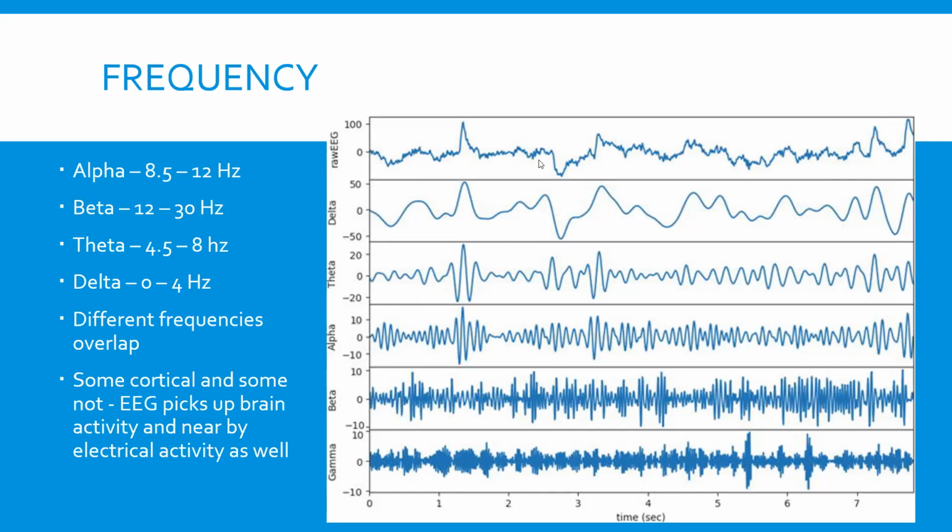So usually the raw EEG needs to be processed so that it's visualizable, right? But it's also important, when you're reading the EEG, to understand that usually we're not looking at just one frequency. There's also this embedded smaller stuff, right? So you see the big delta, and then inside it, on top of that, there are all these smaller frequencies. And that makes sense, right? The brain is not just one frequency, the brain is multiple frequencies.